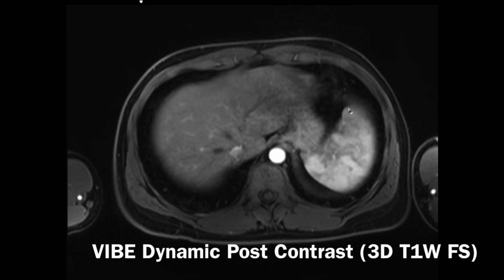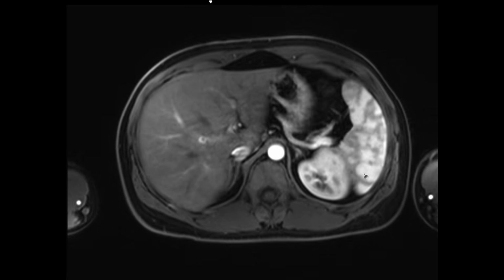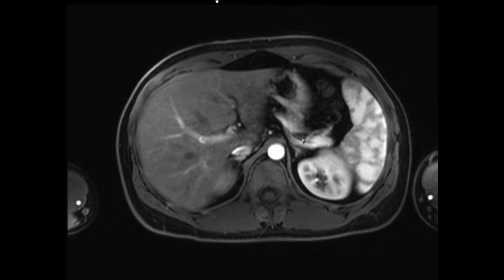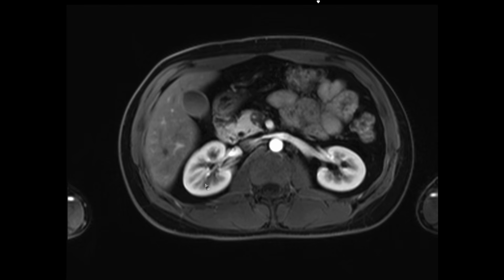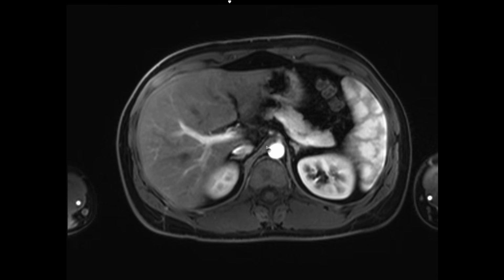Then we have our post-contrast images, so we have our dynamic arterial phase images. And so here you can see that the contrast is now on board. We've given gadolinium. We can tell it's an arterial phase. We have typical tigroid appearance of the spleen. We know it's a good arterial phase because the arteries are well opacified. We have great enhancement of the pancreas. It's in a corticomedullary phase, the kidneys. And specifically, we have opacification of the portal vein that's early.